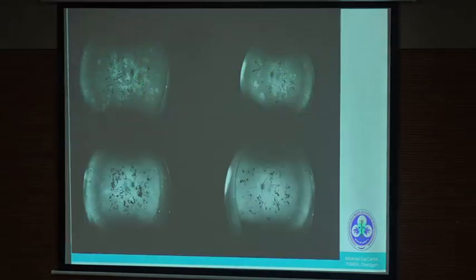In all the choroiditis patients, we get the autofluorescence, we don't get FFA. We see that all the lesions become black. All the hyper lesions will become black. They will never become iso. Hyper to hypo is a win-win situation. We win the war. This is where we use fundus autofluorescence in these patients.